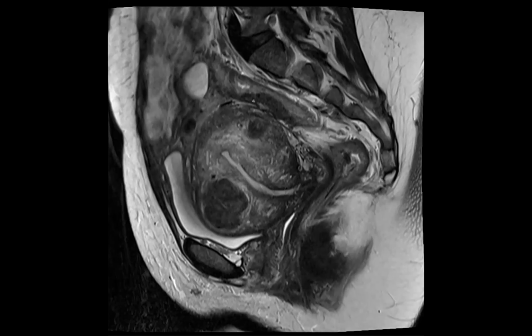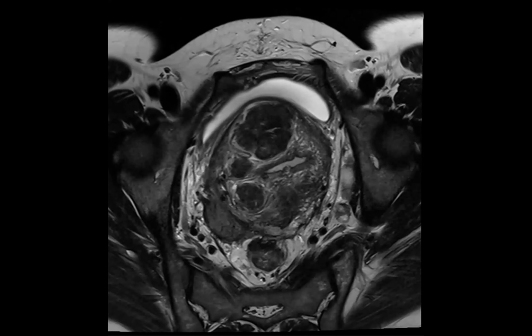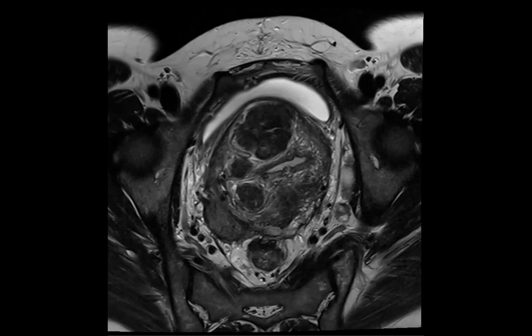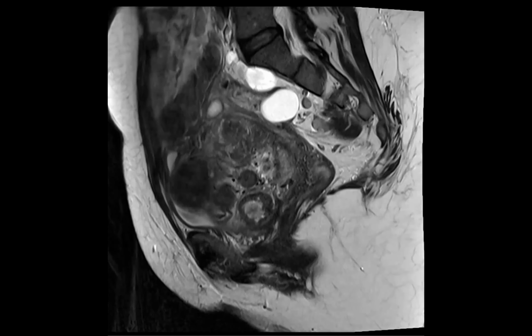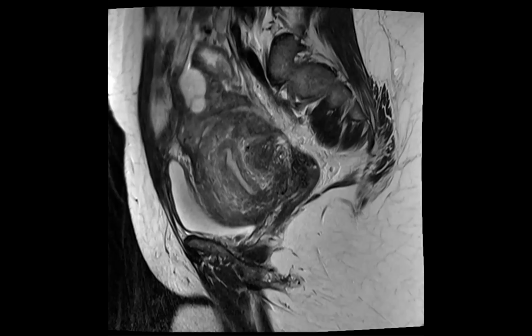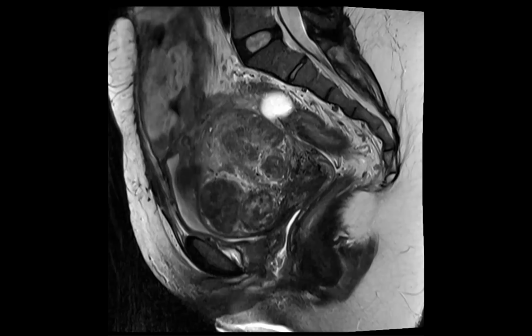So we give the length, and then there's DIE everywhere. And so our GYN, they want us to mention if it's involving the muscularis propria or if it's just the outer serosa. They want us to give the circumference because I guess if it's over 50%, then they have to do a segmental resection. They can just scoop it out otherwise. And they want us to provide the length of disease because if it's a super long length, then they can't scoop it out. They have to do a segmental resection, which is what they did here. And there is DIE everywhere. That's the most significant part. There's like along the pelvic side wall.